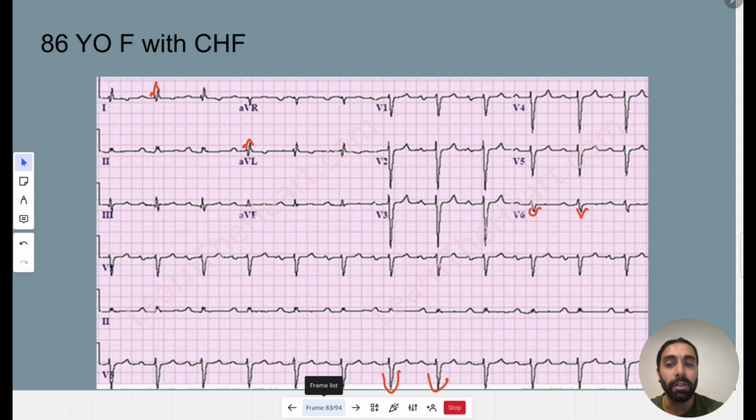If it's an old left bundle, you are not necessarily too worried about it because it could be from an old MI, it could be from CHF, it could be from a few different things. And one little caveat, one aside, is if somebody comes in with chest pain and you get an EKG like this, you can't do a regular EKG stress test on these patients because they already have an underlying rhythm disturbance that is hard to read if they do have an ischemia. So these patients would benefit from a nuclear scan or a stress echo, something like that.